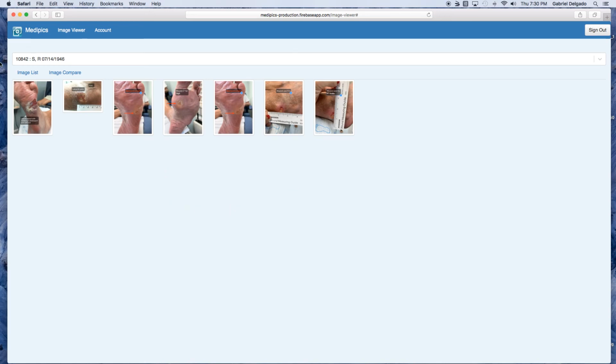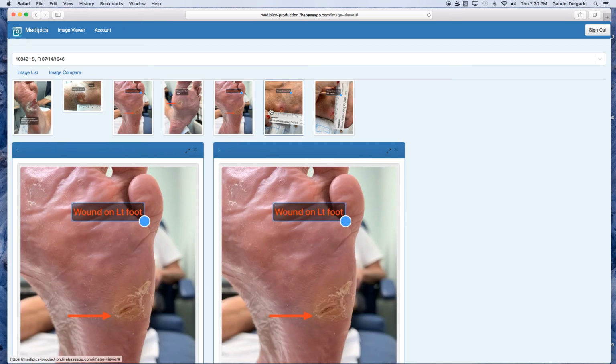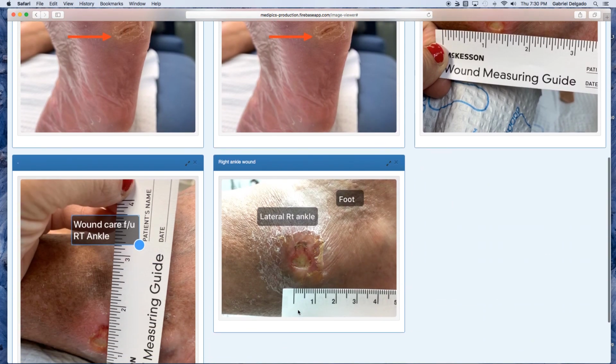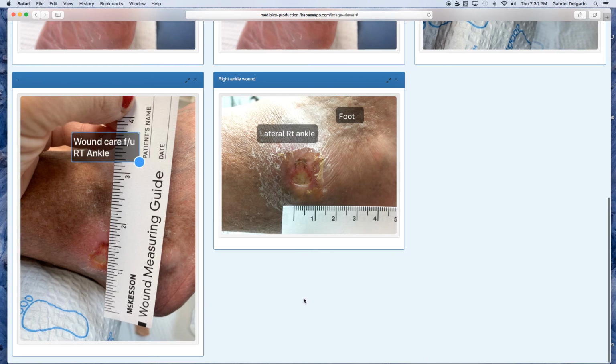So we're continuing to work daily in programming to improve the presentation and give you some options. But as it stands, it's very quick and very easy to select multiple images, and you can just keep going. So for those of you that shoot tremendous numbers of images of the same exact thing, you can just keep going here and just go up and down.